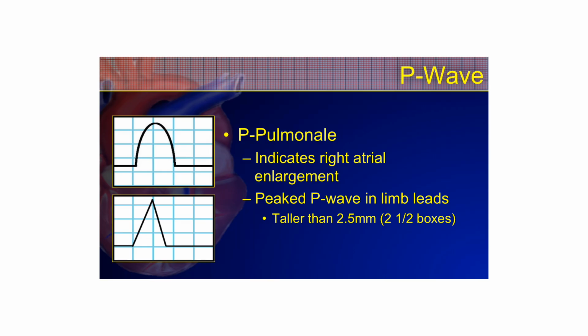If you don't know about this, then you may be wondering, well, why does the P wave look like this? And then it concerns you because you might be thinking it's some funky dysrhythmia, when all along it was just something that the patient chronically has due to something like CHF. So that's why it's helpful.